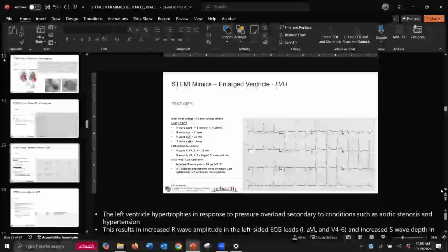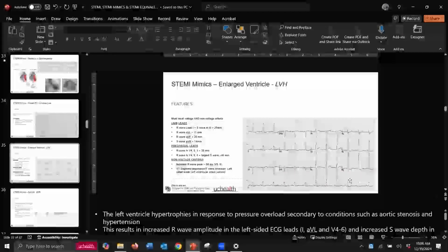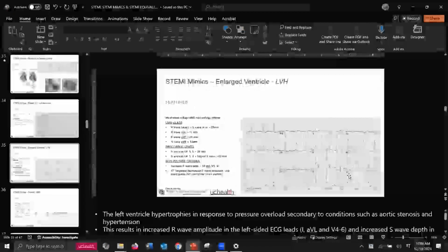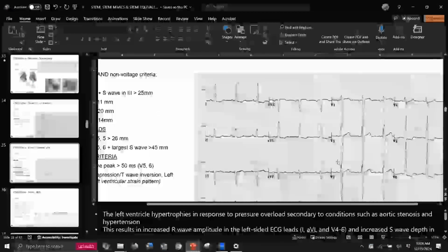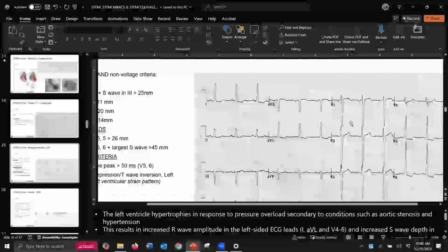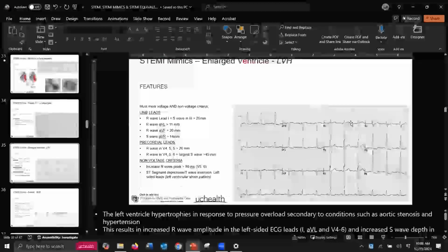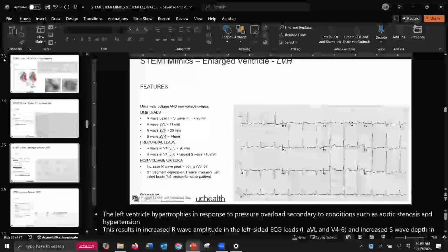Kind of a simpleton. I'm from the Sandhills, I'm high foreheaded, I'm redneck. If it touches in the EKG, it's LVH, right? See what I'm saying? See where it touches? That ain't supposed to happen. That's LVH, okay? Or you look at the numeric values that cardiac monitors are really good at assigning, and you add them. You ain't got to count nothing, okay?